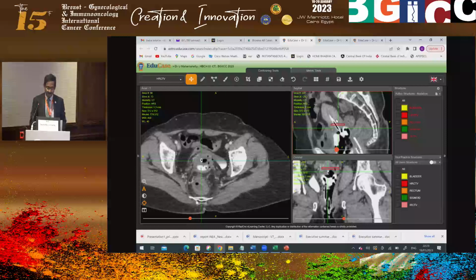And second thing is, if you appreciate nicely on your screen, the tissue below the narrowest part is hypodense as compared to the uterus. Okay, so that is cervical canal, that is the cervix. And that you can appreciate only when you are playing with IV contrast, and if you have an injector, play with arterial phase, venous phase and capillary phase, and you will find lot of anatomy which you can appreciate, which you never did when you do external beam planning. Okay, so then that helps you to understand where your upper contour should be.